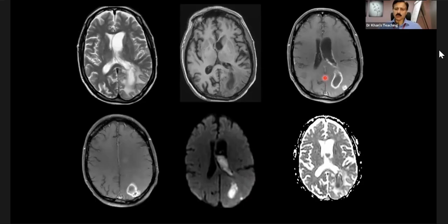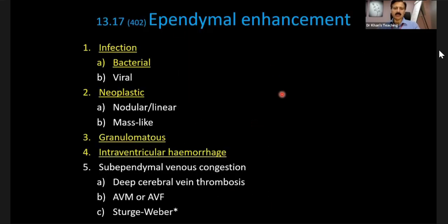Now the examiner will show you this type of a scan. If you see here, subtle finding, this is low signal, but this is slightly different signal. And you are struggling if there is a level there. The king sequence here is the DWI, which shows that within the ventricle, abscess, pus is sitting there. Actually, there was a parenchymal abscess, and you can also see ependymal lining, which is enhancing. So the idea was to show you ventriculitis, ependymal enhancement.